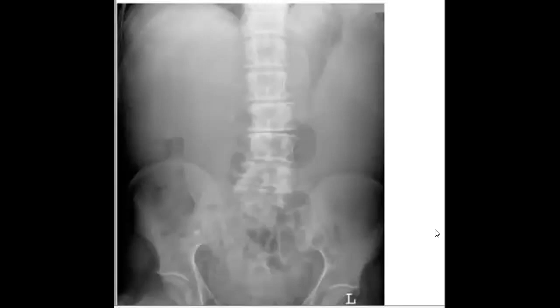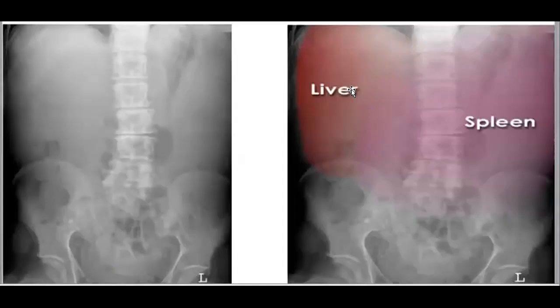So again, another example. There is some displacement of the bowel loops, soft tissue retraction here, and probably here. So there is probably hepatosplenomegaly. That's the case, there is hepatosplenomegaly. So they are pushing the bowel. Yes, so some bowel is insinuated here, some bowel is here. Perfect.